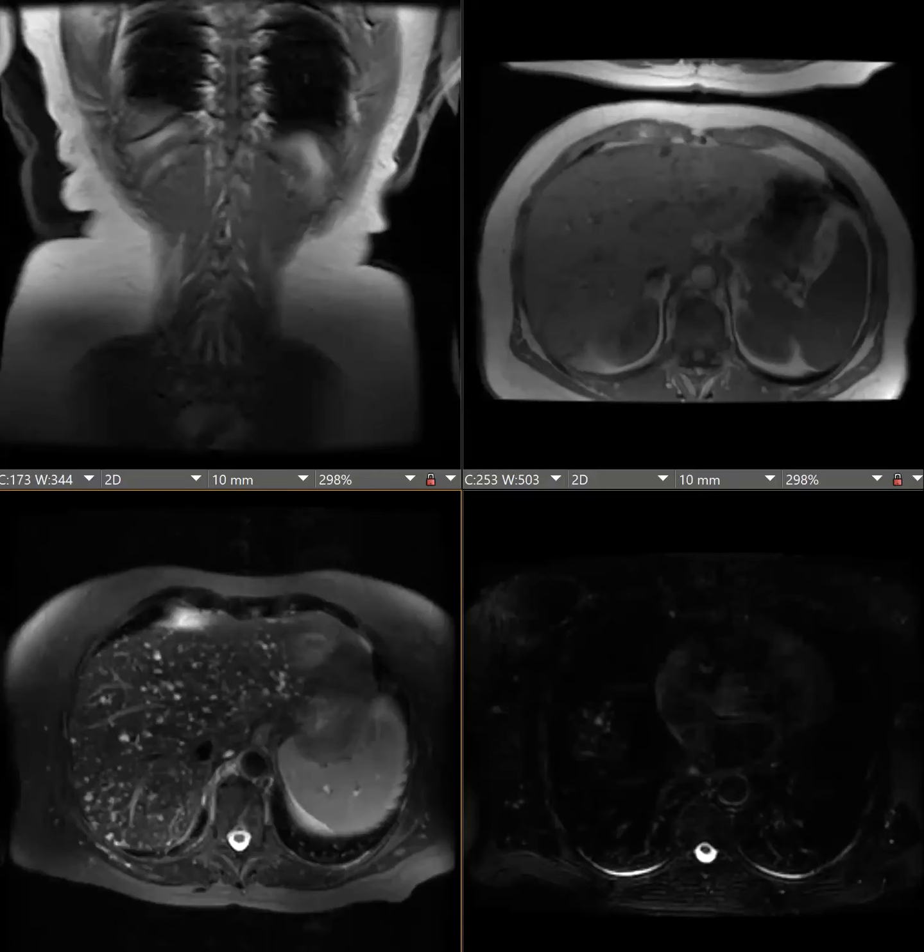I just said the peliosis was hard because it looked triangular, almost wedge shaped. It looked like vessels going through, sometimes like how you see with focal fatty sparing or infiltration. Except on the T2s, it's a little intermediate. It looks like a lesion, not liver, on the T2. So it was a tricky one. I also don't think anyone would have called this prospectively.